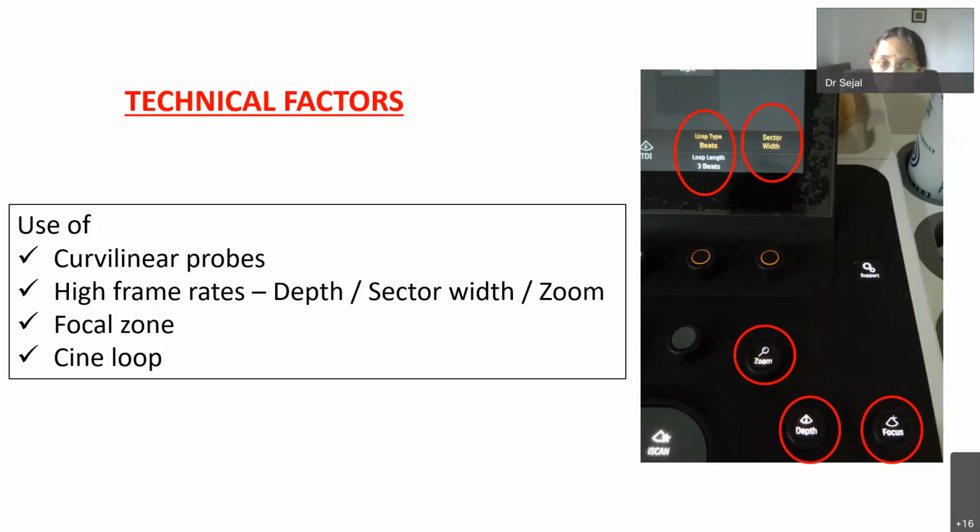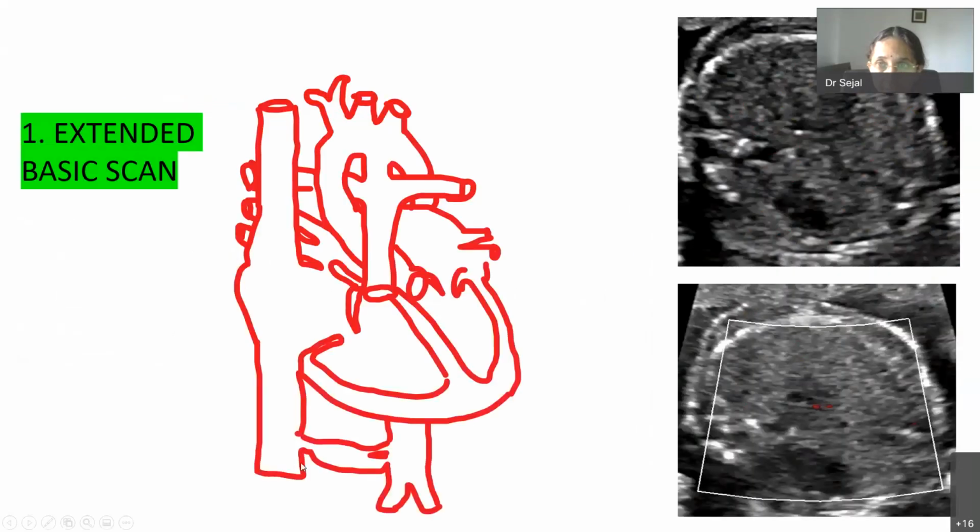and not to be apprehensive during the study. To start, we are going to see just a gross idea of how the imaging is done in fetal echo. So this slide is important. Now, remember that most of the cuts in fetal echo are axial.